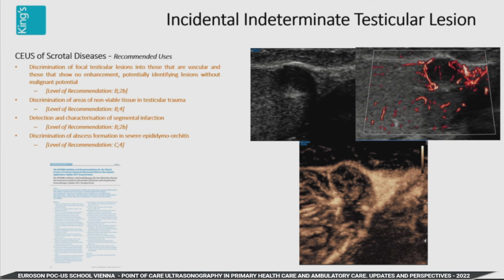There is no doubt this is a vascularized tumor. But this isn't an incidental lesion, because you can palpate it. You can see that it has indented the surface of the testes, and it's palpable. So it's not an indeterminate impalpable lesion. It becomes a lesion that you can feel, and that's different from the indeterminate one.